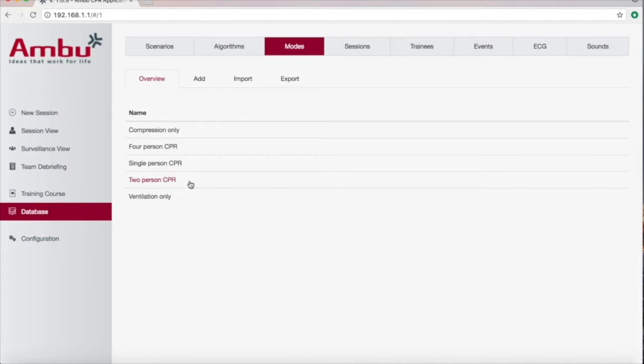So in other software systems, it's an all-pass or an all-fail system. 1 person passes, 1 person fails, they both fail. In our system, you can actually separate these 2 folks and track them separately. 1 person actually passes and 1 person fails. So this is a big advantage in your training parameters.